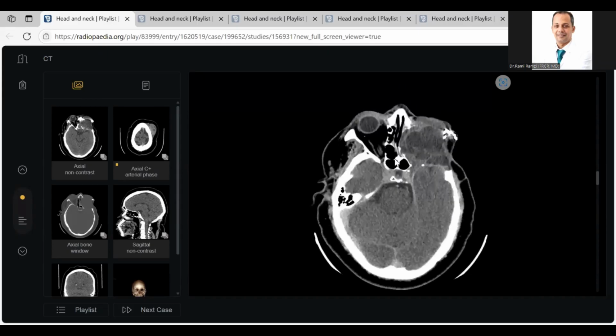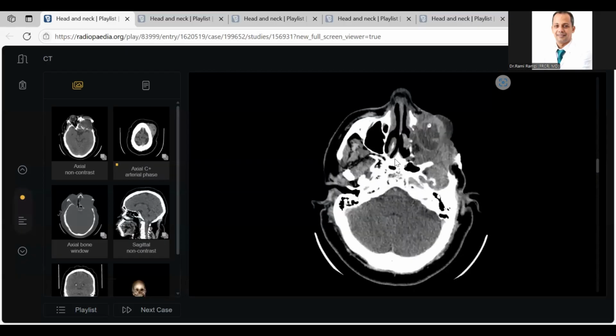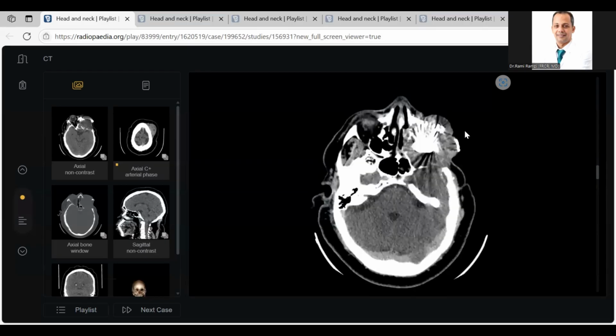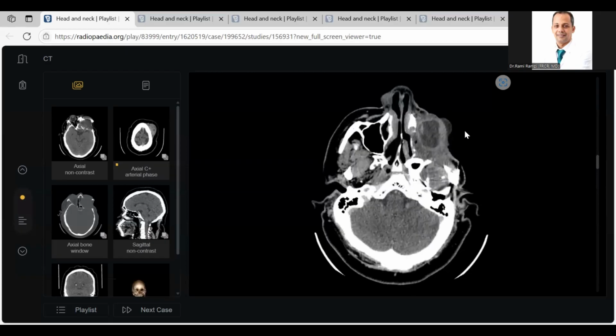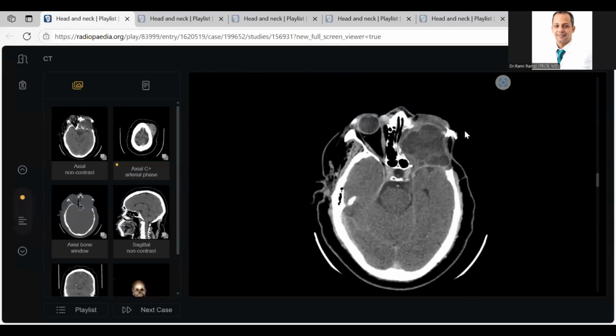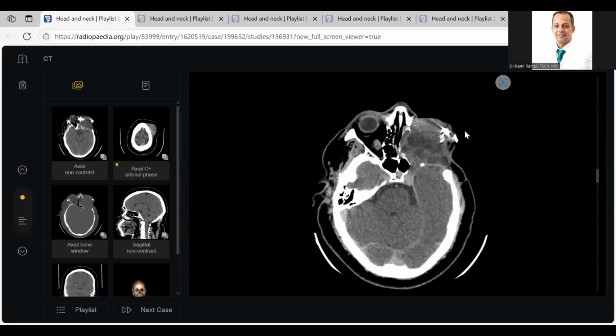One concern is an abscess. Not abscess, because the lesion is hypodense. This is a true tumor, heterogeneous. When the tumor comes again, what is the diagnosis? Not metastasis. Recurrent tumor. Recurrence of the tumor. Excellent, doctor.